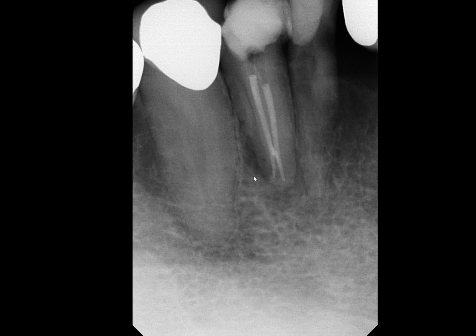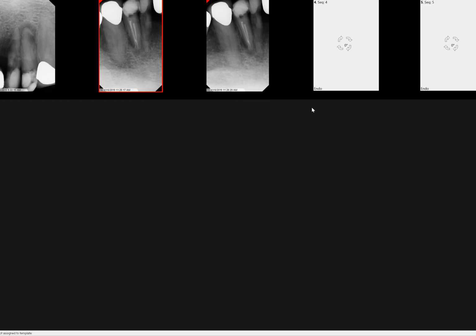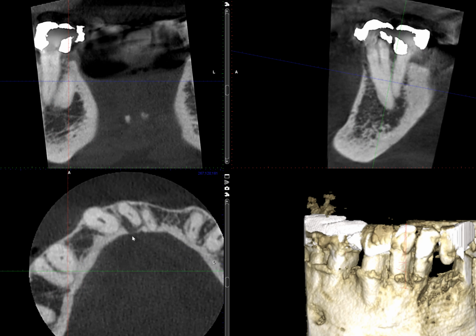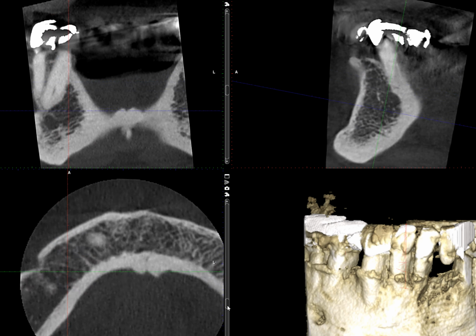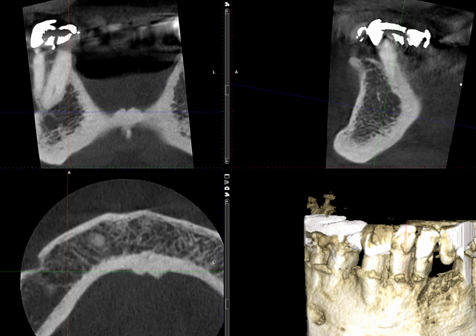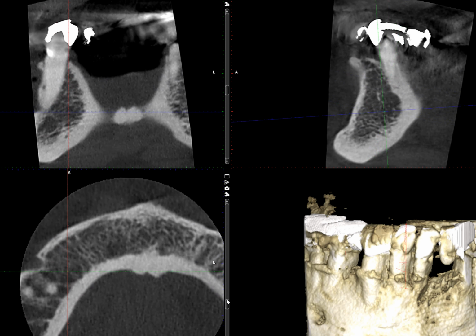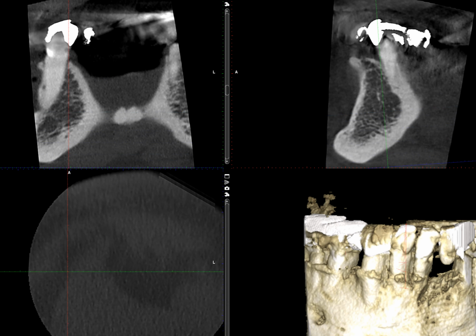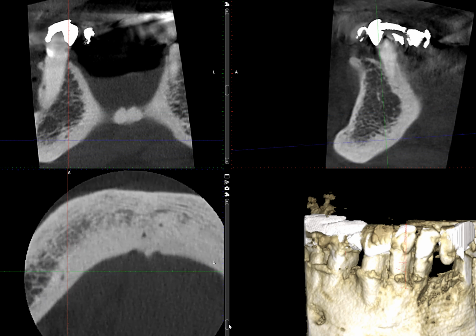We want to know what's going on three-dimensionally. And in addition to that, we want to perhaps better visualize this area. Okay, so now I'm going to show you a CBCT scan of this area. First, why don't we pay close attention to our axial plane? So pay attention to this plane. I'm going to start from the bottom of the scan, move superiorly.